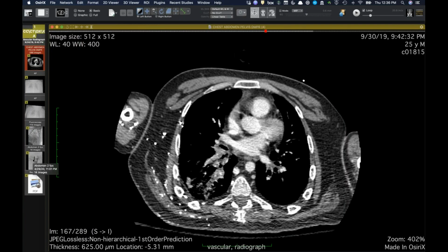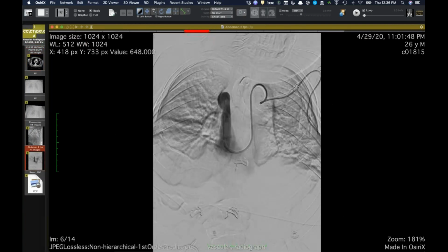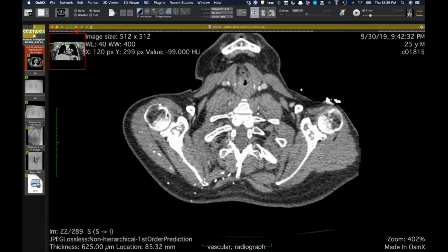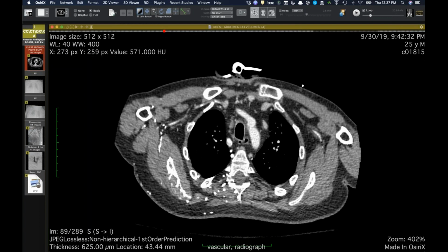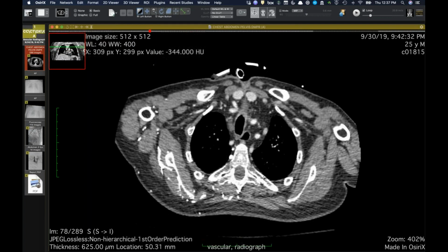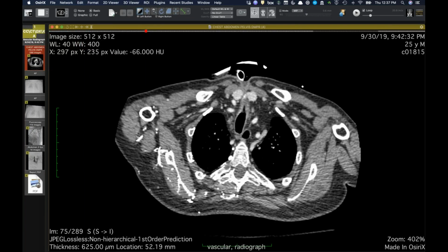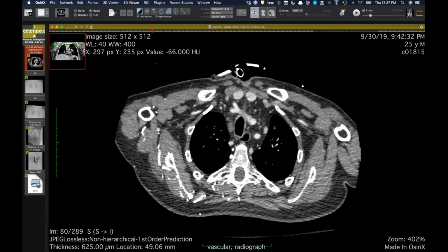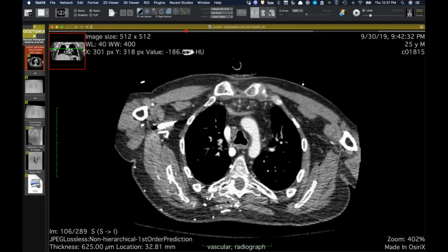That upper branch of the hemiazygos system is called the accessory hemiazygos when it's the top half of the chest. That's what the LSIV, the left superior intercostal vein, goes back and drops into, the accessory hemiazygos. So if you want to be finicky about the terminology.